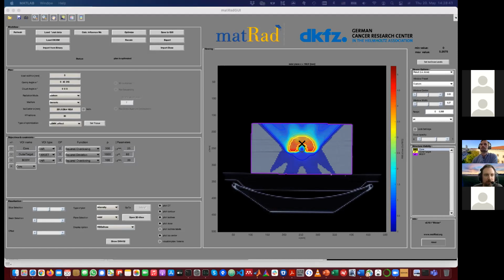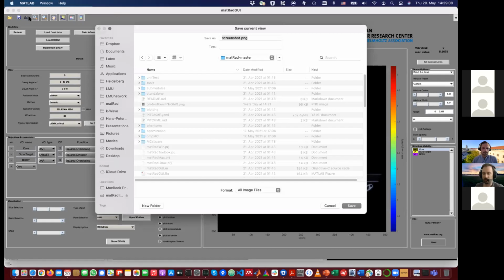Maybe we should also remind the participants to export some dose slices for this exercise to a PNG for their results document. So maybe the RBE weighted dose and the physical dose or something like this. Yes, exactly. That's a good idea. And then we could give a few minutes, and you can also show the alpha, beta, and effect distributions, and that would be, I think, also nice.